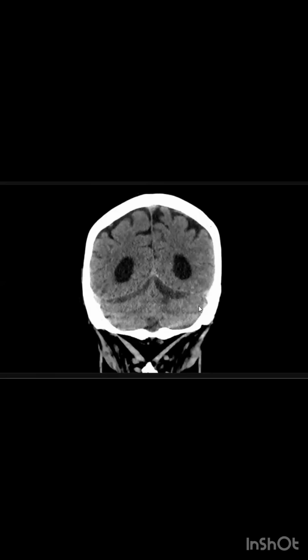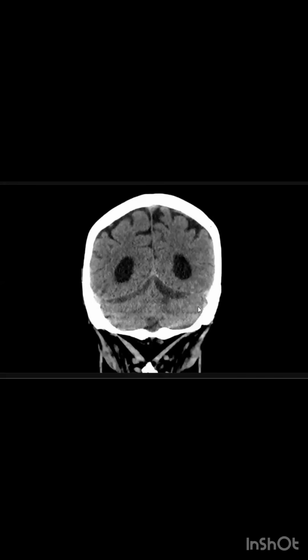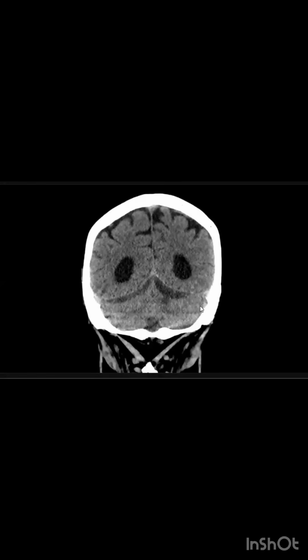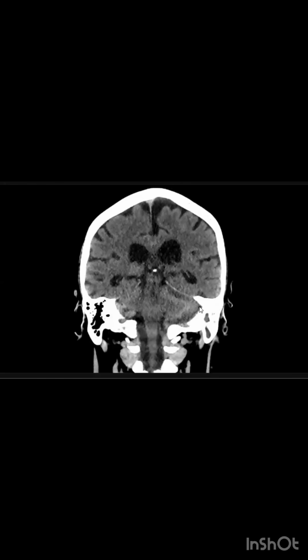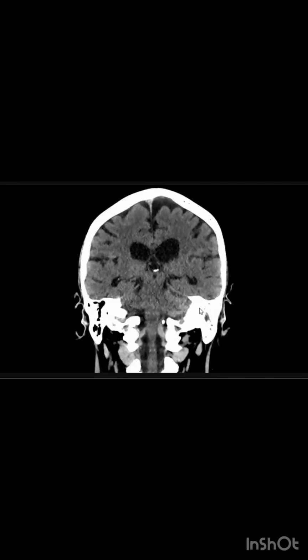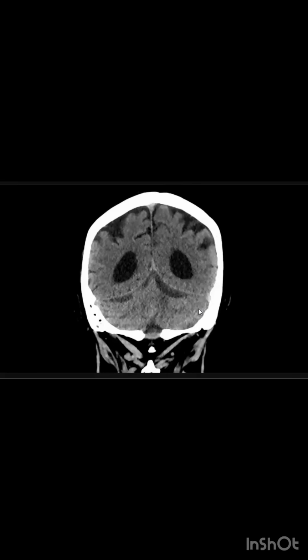Yeah, so these are along the tentorium cerebelli. These could represent subdural collections. How will you report this case and how will you refer the patient? I will refer this patient to the neurosurgical team for urgent management. This patient needs neurosurgical follow-up and close monitoring.